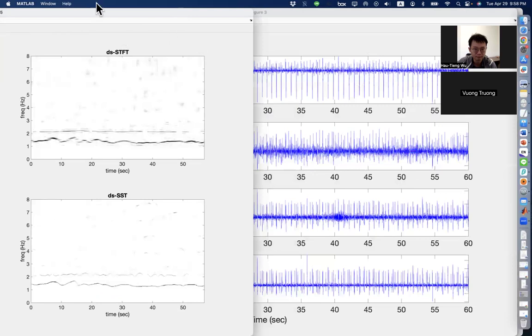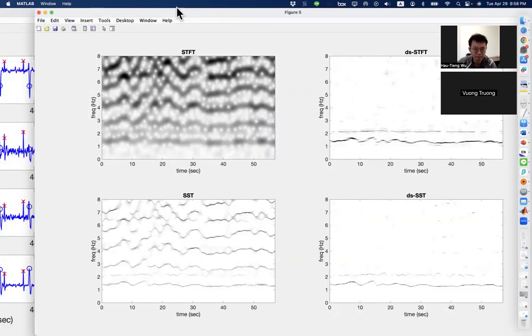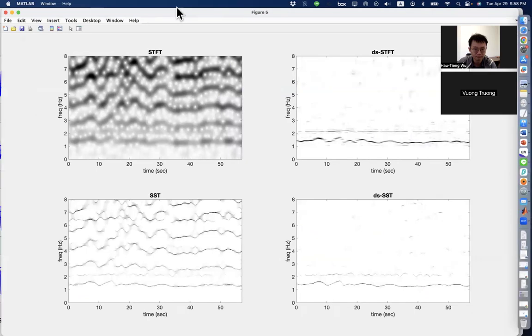So that is where you can apply the Dshape algorithm to help you get the maternal R peaks. And then the next step will be peak tracking to determine where the correct R peaks are and so on. And then you use those correct R peaks to decompose, reduce the impact of maternal ECG and get to the remaining part. And from there, you can get fetal ECG and so on. And that will be the next part of the lecture.